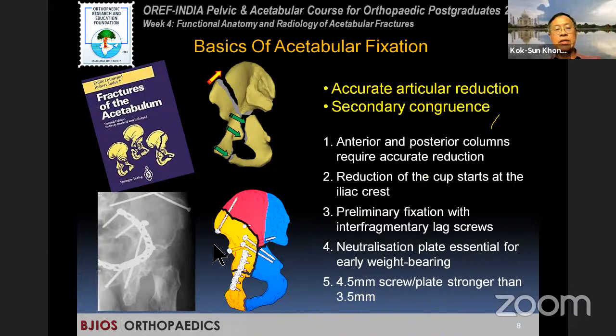It's always stronger, and you can see that it's a bicolumnar fracture. There's a minimal screw fixation. I just use two behind, one in the posterior column, and then one or two more along the anterior rami, and that's all there is. The power of the screw fixation is very high because the screws are larger diameter and they have a powerful reducing element.